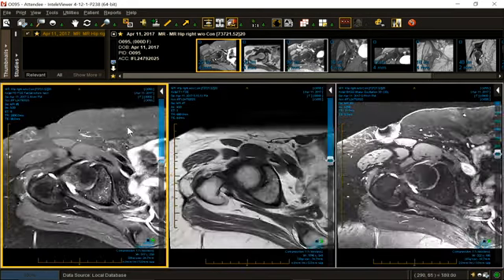And now let's go to the sagittal and the coronal, where this patient does have swelling of the abductors. What are we going to do with that? Well, unfortunately, almost all middle-aged women who are overweight have swelling of the abductors. So when is it important? When they have pain in the abductors. And that pain can be incredibly debilitating.